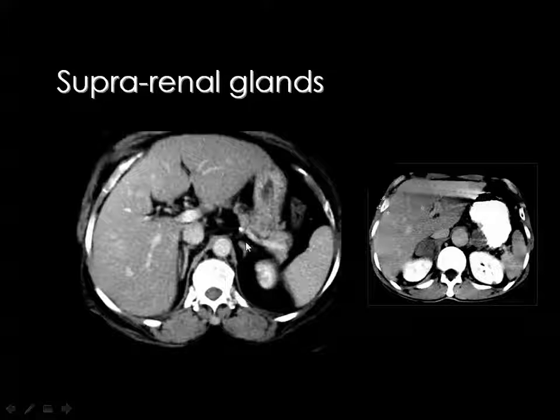And so we give him instructions to continue the scan until he can see the suprarenal gland. And the suprarenal gland is like an inverted Y above the upper pole of the kidney. And this is the right suprarenal gland, and this is the left one. And this is an example of bilateral metastatic deposits in the suprarenal glands from a case of bronchogenic carcinoma.